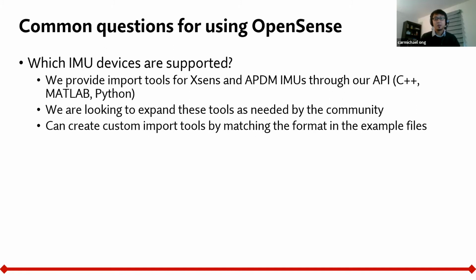You can also create your own custom import tools by looking at the format in the example files and matching that format by developing your own custom code in MATLAB, Python, or whatever languages you like.